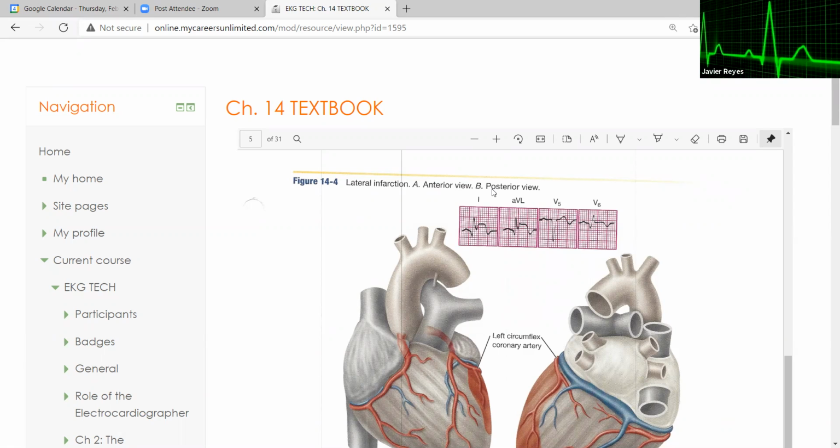Oh, but yeah, we heard it, you can, right? Okay, so analyze this one. Okay, make it a little smaller. Because yes, I have a small computer, right? Like she has a big computer, she probably sees everything, right? No, but then I got it. Oh, okay. All right.